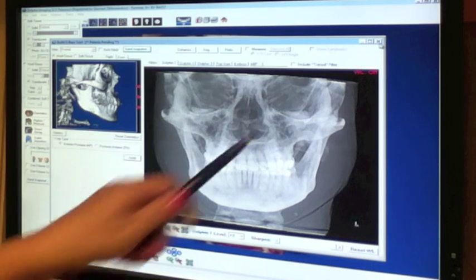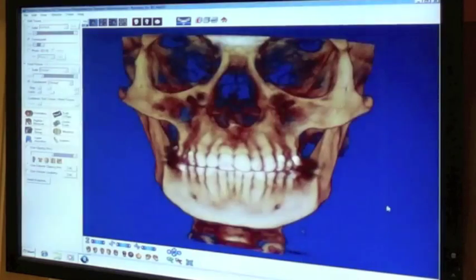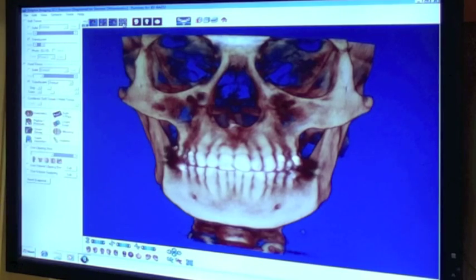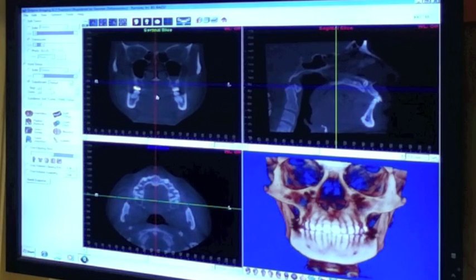And then you can exit out of the Build X-rays tool. And then you'll want to click on the 4 equal slices volume layout icon. And that'll take you to the coronal, sagittal, and axial slices. The red crosshair will change the sagittal view. Sagittal is in red.